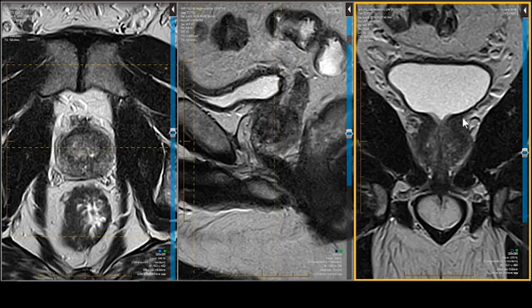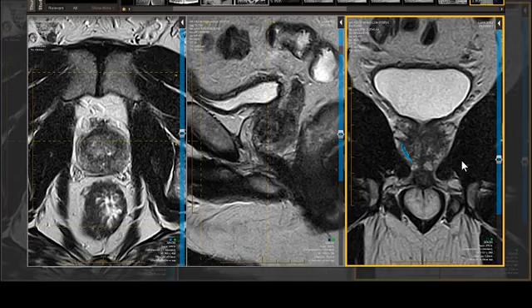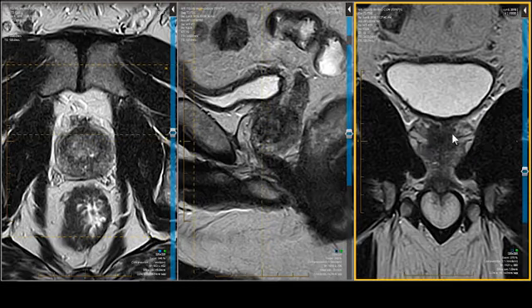Coming forward, central region of the prostate, a little bit of peripheral region, a little harder to see. There's a little more peripheral tissue. I'm going to draw over it right here, there, and there. And then we keep coming forward. Now we're starting to get out of the prostate gland. We're in the fibromuscular stroma now, which assumes a bit darker character.